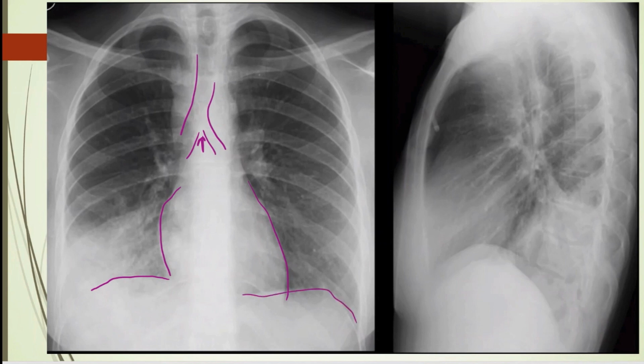Left looks okay. And everything else, lung markings all the way out. But you look here, and this diaphragm here is obscured, called the silhouette sign, so you know something, a consolidation is there. And you can see all this fluffiness in here as well. So they have an infiltrate/consolidation here. It's probably a pneumonia. So you want to tell where it is.